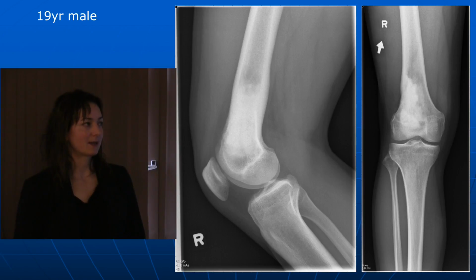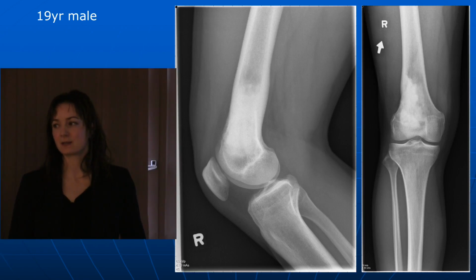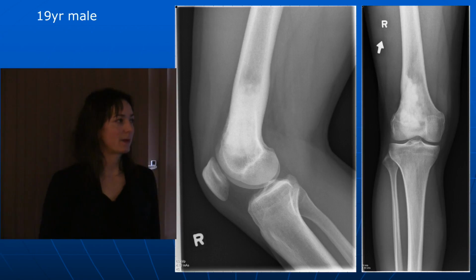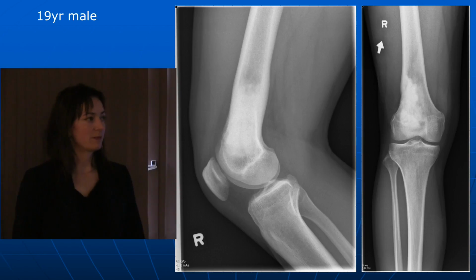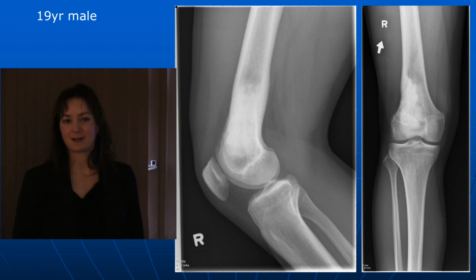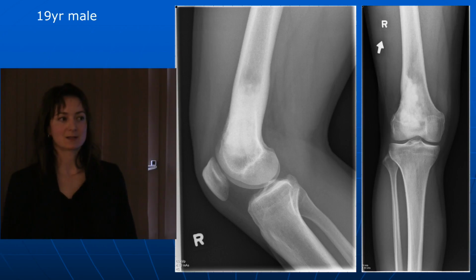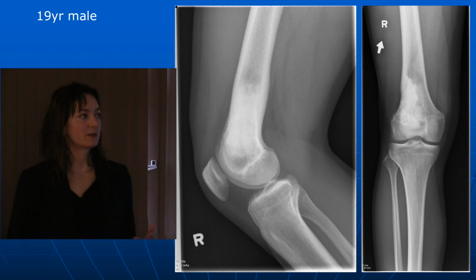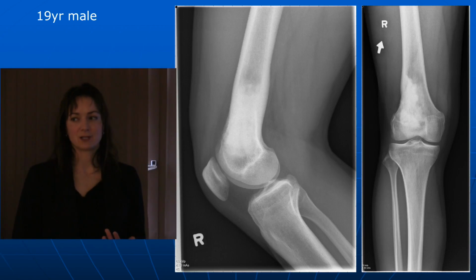It doesn't look like the case of fibrous dysplasia that I showed you that was non-aggressive. You can't draw around the edge of it, but it hasn't produced a periosteal reaction. But look at the matrix, it's produced bone. So anything that produces bone is bad news. So remember that case that I showed you right at the start, the prostate metastasis, sclerotic produced bone, mixed lytic. So this has produced bone. So this is the matrix you would say for this is osteoid or bone formation.